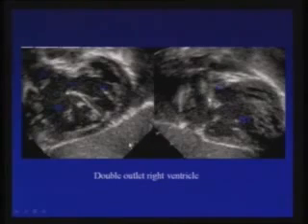Okay, and the pulmonary arteries are this. So pulmonary artery is 100% committed to RV, while the aorta is 80% committed to RV. So this is a case of double outlet right ventricle. Aortic valve attachment here, mitral valve here, so you are getting the mitral aortic discontinuity, commitment of aorta. But it is a correctable lesion, you do not require any conduit or anything. VSD can be routed to the aorta, pulmonary artery already committed to the RV, normally related great vessels. So the child underwent surgery like a VSD.